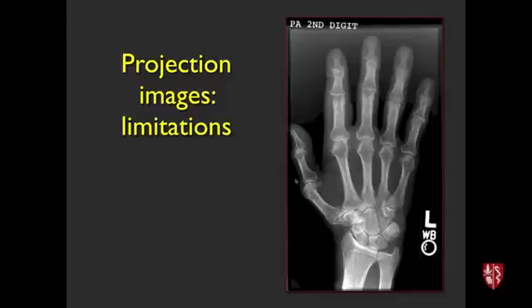So here's an example case. Here's a hand, right? And does anybody see anything abnormal about this patient's hand? Any obvious injury? It was trauma and pain.